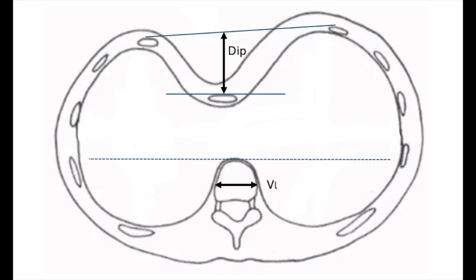Well, you take the highest line, which is the most anterior-most point of either the ribs or cartilages between the left and right chest, and then you measure down to the anterior table of the sternum, not posterior, anterior, either of the sternum or cartilages. And then again, this uses the very independent measurement, which is the measurement of a vertebral body, because that's very correlated to your height, but actually for some technical reasons, it uses the lateral horizontal diameter of this. So we're going to use this because it correlates to the Mayo and Phoenix.